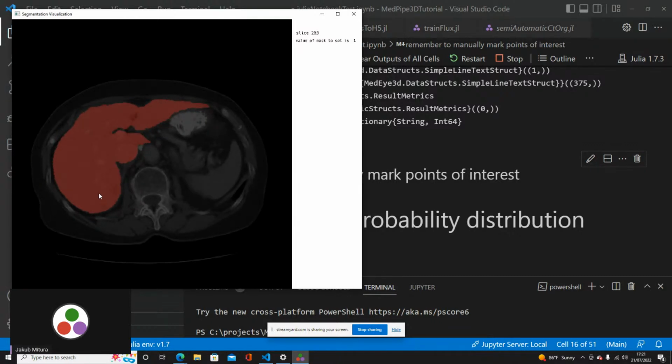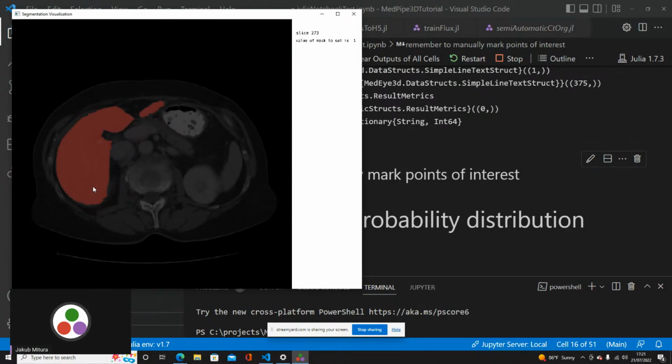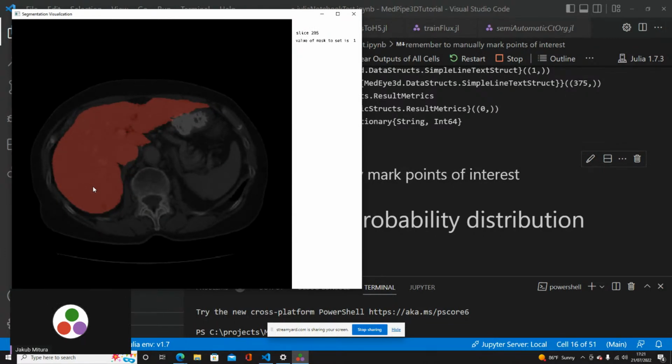It's also important not to have anything outside. If you have, just reload. It will be the simplest for now. But we need some spots in the liver.